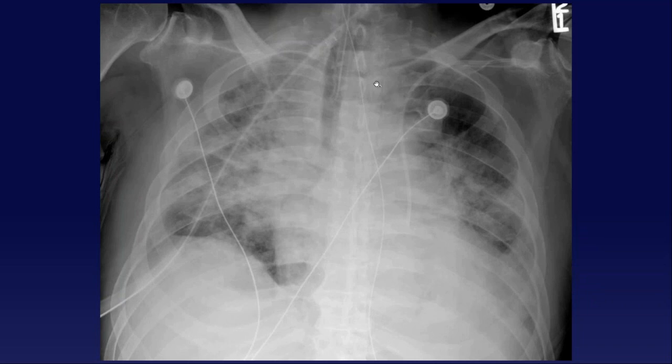Oh, better, yeah. So this is probably going into a left-sided SVC, although we can't fully exclude arterial positioning here in the aorta. So for something like this, I would say don't use it, call radiology, and make sure that it's actually a left-sided SVC. Very often these patients will have prior CT imaging showing that there's a left-sided SVC, or you could also do blood gases or something like that, interrogation with waveforms.